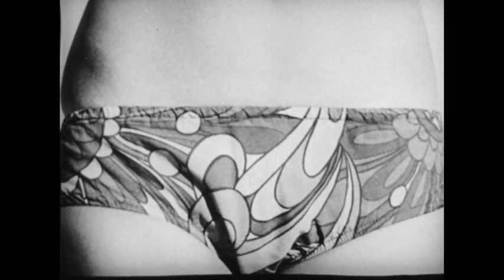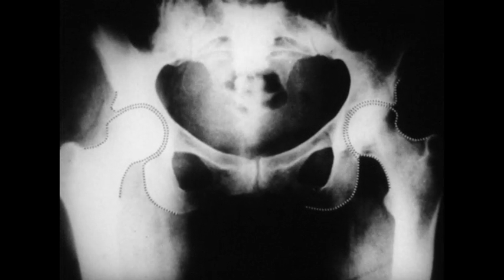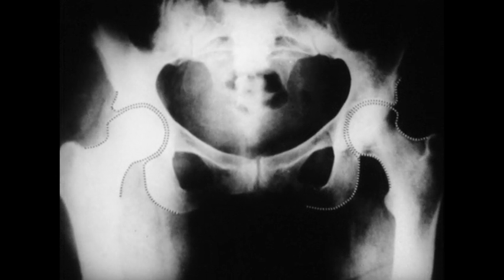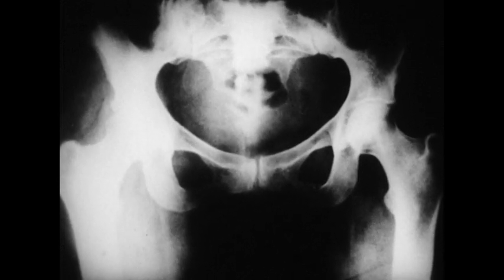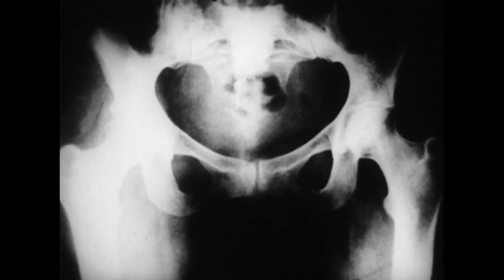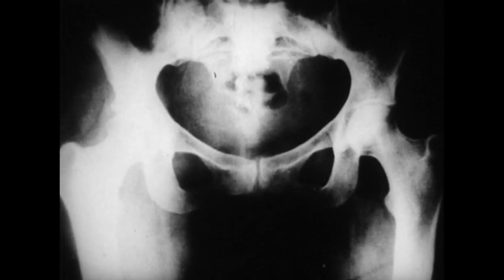In considering the lower limb, we can start with the hip and then proceed to the knee, ankle, and joints of the foot. The hip is a ball and socket joint formed by the head of the femur in the cup-shaped cavity of the acetabulum. The articular capsule of the hip is strong and dense and is more extensive and stronger anteriorly and superiorly than posteriorly and inferiorly. The capsule itself contains the iliofemoral, ischiofemoral, and pubofemoral ligaments.